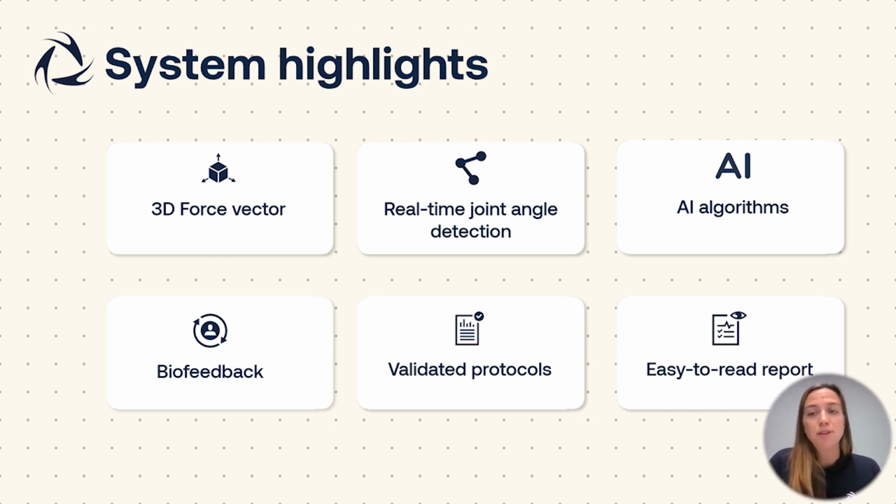Such detailed biofeedback allows athletes and coaches to observe how performance metrics vary with changes in posture, power, and movement, and the examination of real-time joint angles also optimizes sport performance and provides detailed insights into movement biomechanics.